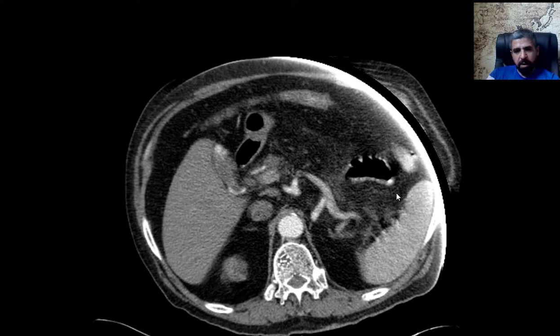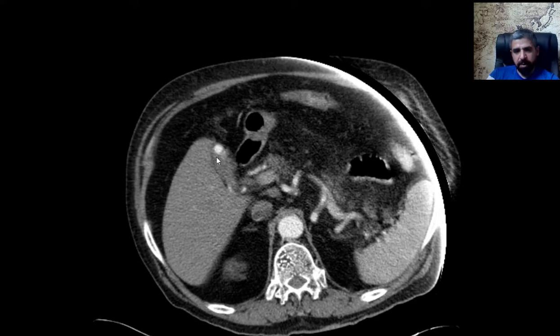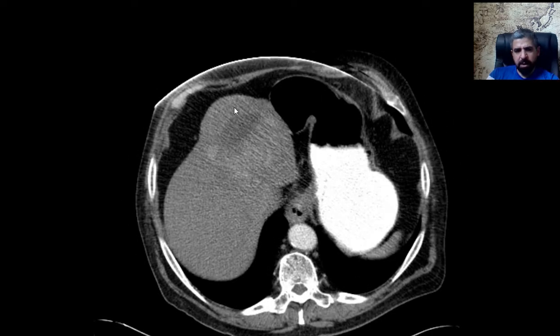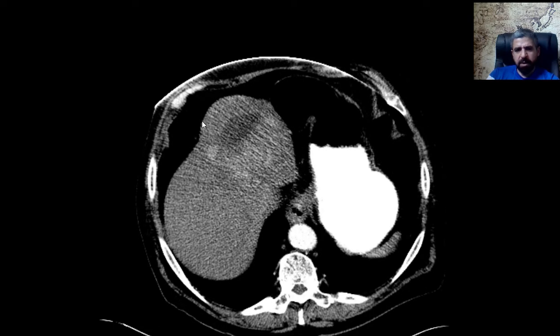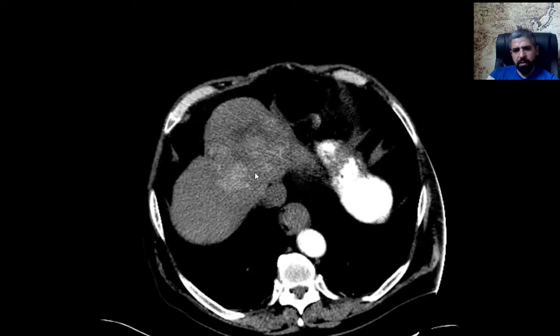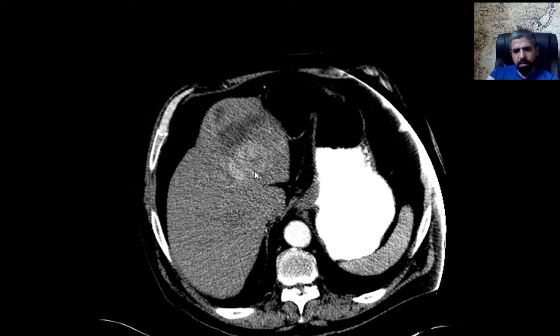It has nothing to do with the patient presentation, and in this particular case it will not affect our findings. First of all, there is this hyperdense something within the gallbladder, which is a gallbladder stone. It is not related to our diagnosis. And the other thing is that there is this ill-defined lesion here. I want to make a hard window a little bit. You can see there is an ill-defined, enhancing, necrotic, heterogeneous lesion in the liver, mainly in the right lobe, and it's necrotic, of course.